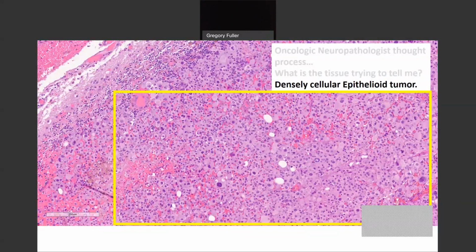Yes, it's epithelioid. Everyone sees, speaking to the neuro, and we have very sophisticated neuroradiologists, many of the neuroradiologists probably looked at this and said, "Oh, I can see the cell borders really well. That's epithelioid." I'm thinking of all the epithelioid tumors that I can think of. Epithelioid glioblastoma, there's a good one, right? It could be a melanoma. It could be ATRT. It could be epithelioid carcinoma. Carcinomas from virtually any epithelial surface can be epithelioid. I think breast is probably one of the most common that we see, really purely disjointed, discohesive epithelioid. Okay, et cetera, et cetera. All right.